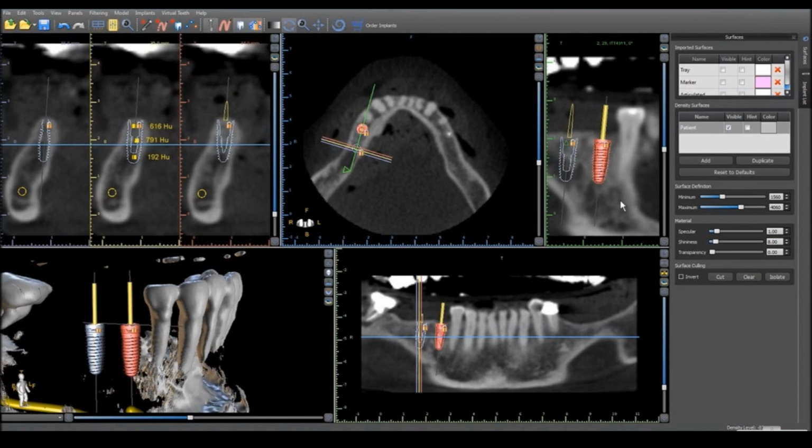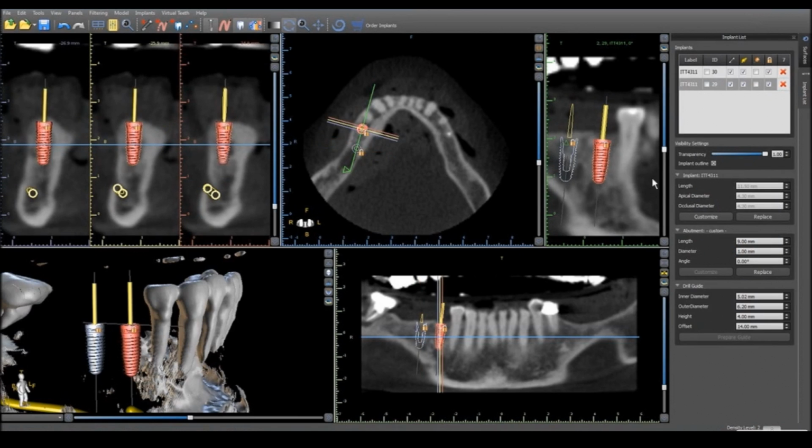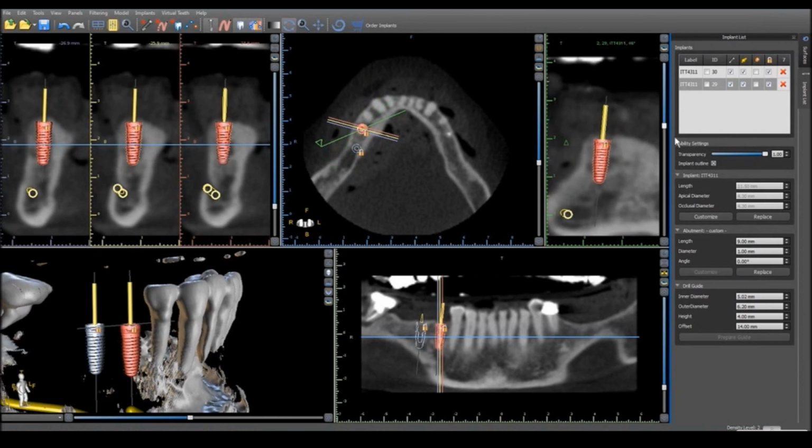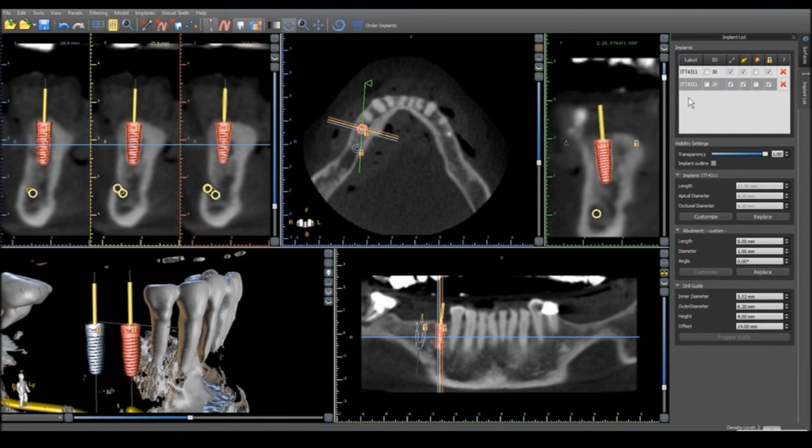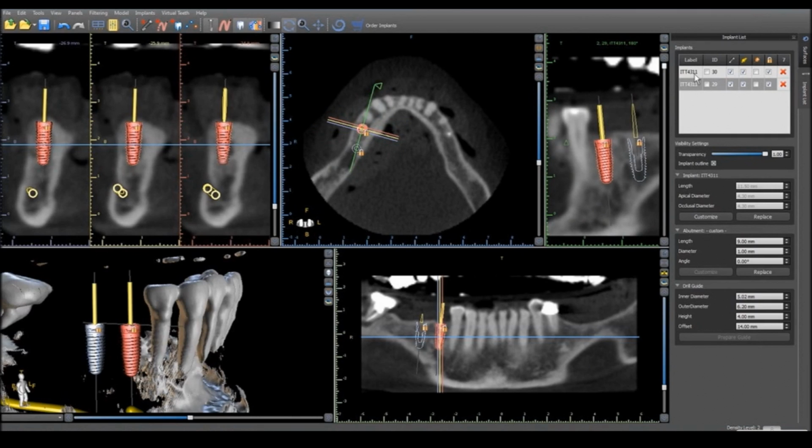This software has something called a tangential view, which allows you to swing around the implant 360 degrees and see its relationship to all adjacent structures. It's a very powerful feature. So right now, it's in a panoramic view, as you would get in a periapical film. So I can see the root of the adjacent bicuspid. Now as I swing it obliquely, now I'm in a cross-sectional view. I can see how much buccal bone I have. And now back to a panoramic view.